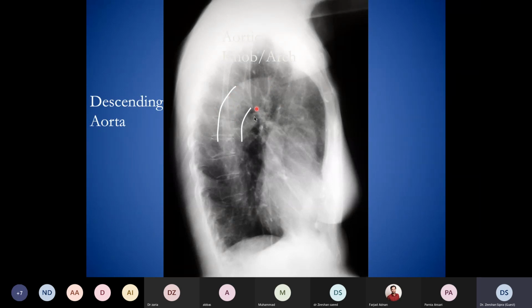So this thoracic aorta is descending in the lateral radiograph. It is originating like this in the arch. It originates anterior and goes obliquely posterior. On the lateral radiograph, it forms a true arch over here like this.